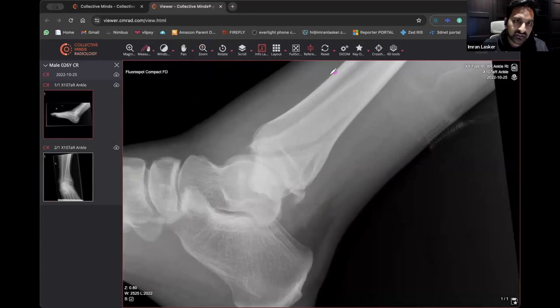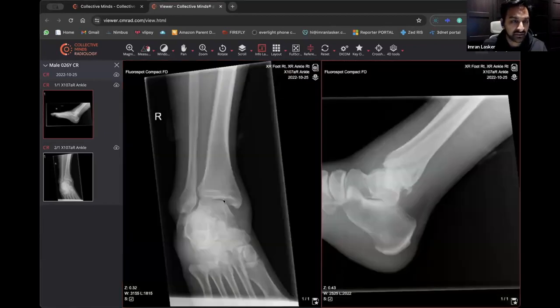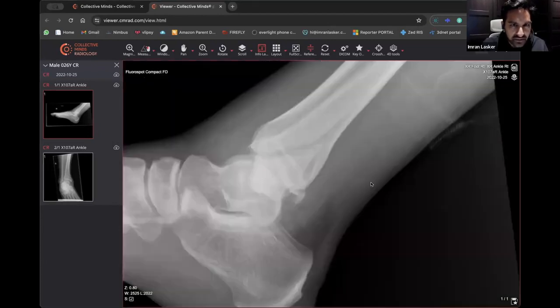So let's draw around. This is going to be the tibia. We're coming around this way, and then the tibia does this. It feels like there's an abnormality maybe here around the back. But more importantly, we're going to come over here, and you can see that there is radiolucency. It does this, and you can keep drawing like this, and it goes all the way around. So what I've essentially drawn is a fibula, so a lateral malleolar fracture, and I would be concerned there's also a posterior malleolar fracture as well. Then we should look and see whether this could be a trimalleolar fracture, where you've got medial, posterior and lateral. But I can't see a medial ankle fracture at all.